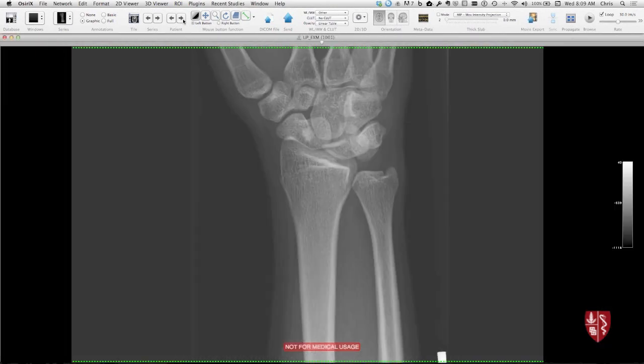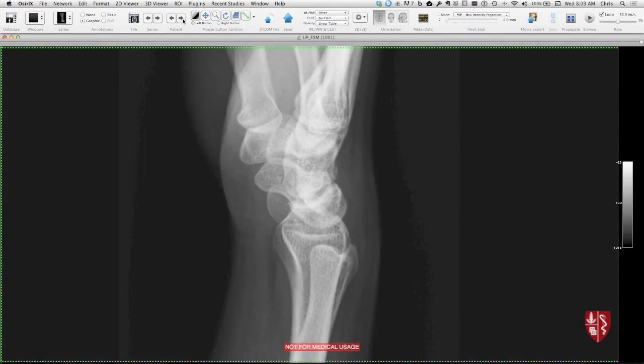Different patient here, and this is that opposite situation. So, good lateral view. See the lunate is volarly tilted here and the scaphoid's here. If we drew that scapholunate angle in here, you'd bisect the lunate like this. You'd find the scaphoid, go along the palmar cortex of it like that, and then this would be the angle. I don't have the actual measurement, but it looks like it's decreased.